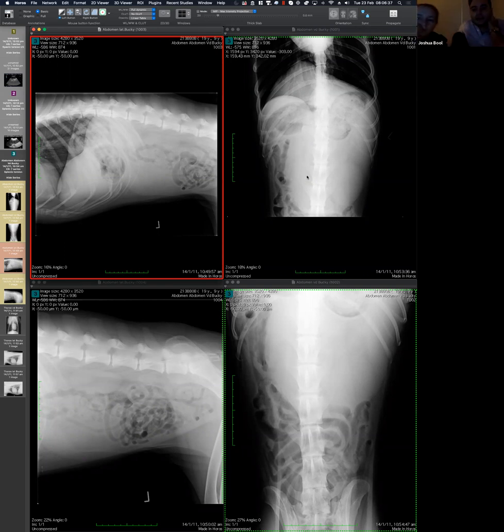I think probably mass effect more than anything, especially because that area is so rounded. It does seem almost circumscribed, like you can see that round area. I guess the other possibility is a fluid-filled, sectioned-off area, like the retroperitoneum, but I think that's probably unlikely just because I've never seen that before.